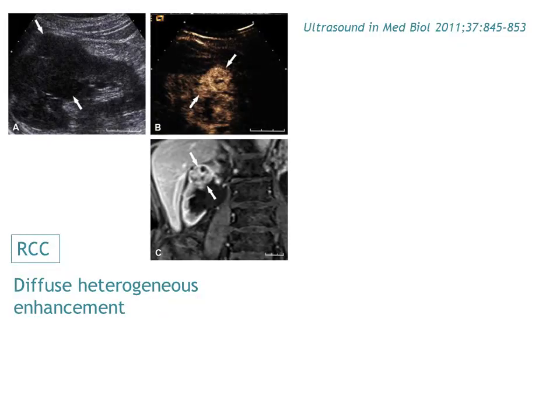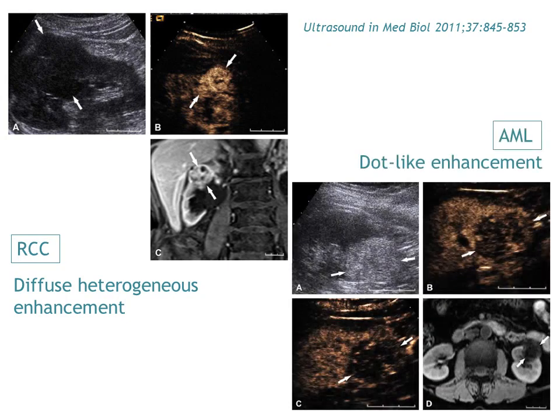This is a case of renal cell carcinoma in that article showing diffuse heterogeneous enhancement, and this is a case of angiomyolipoma showing dot-like enhancement.